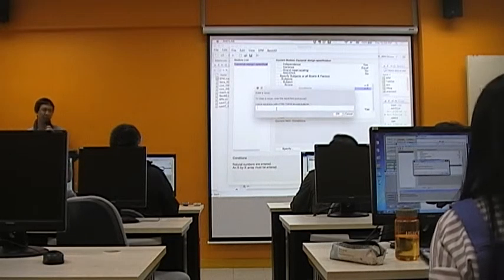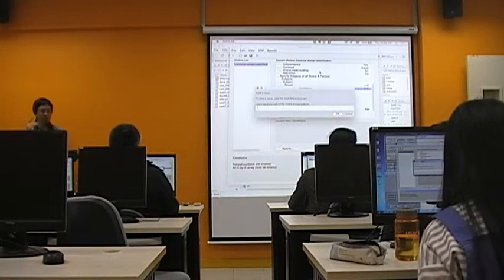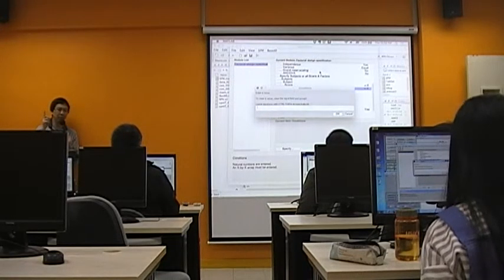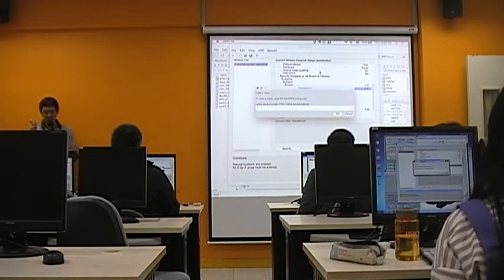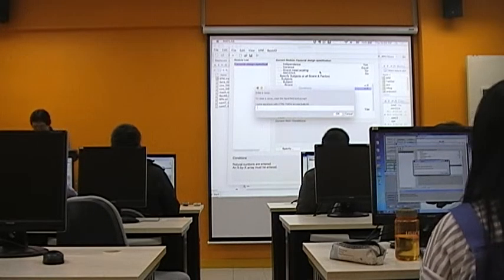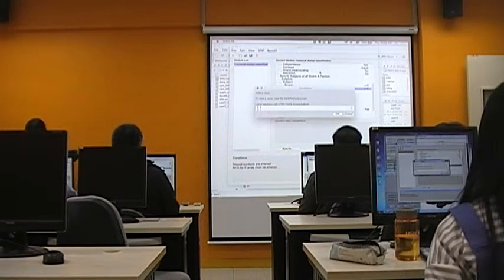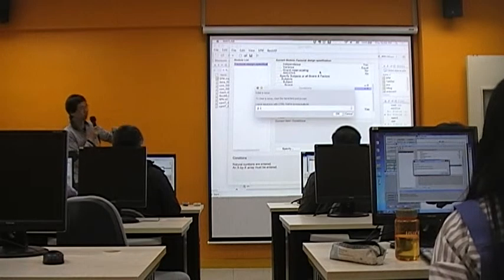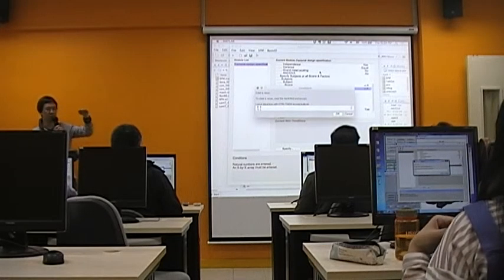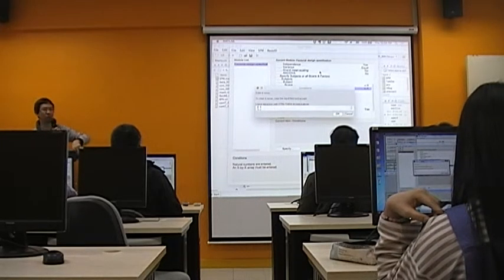And let's say we have 2 subjects or 10 subjects. In this case you need to make reference to the order of factors you have before. The first factor, if you remember, is the working memory, and in the respective column you should code the image. So I'm putting 1, 1, 2, 1, which means that each row of the matrix represents the image you put in, and each column represents the factor it corresponds to.